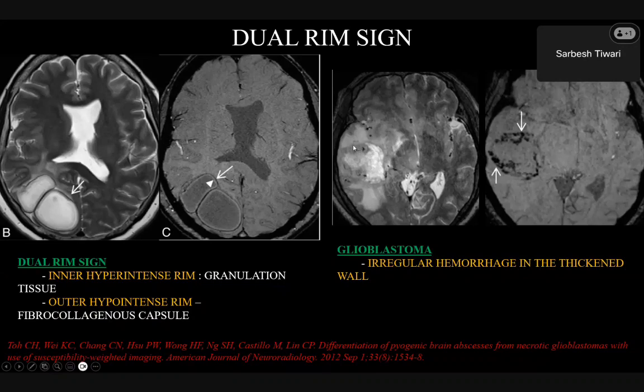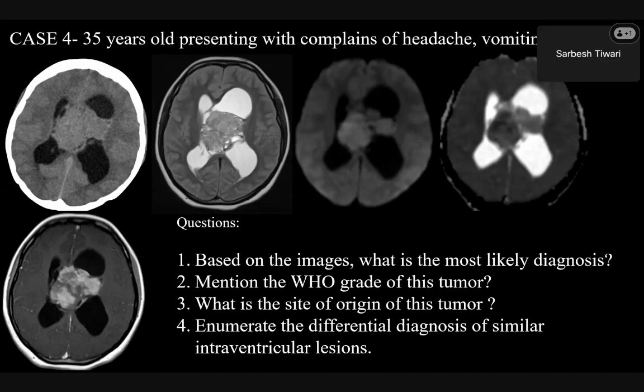All right, everybody's writing neurocytoma. So this was an easy question. Okay, the second differential that has come up is choroid plexus papilloma, and then central neurocytoma. Based on the images, SEGA is a very good differential, excellent. So you have given me all the good differentials here. Anything else? Central neurocytoma is not grade 1, it is grade 2 only.